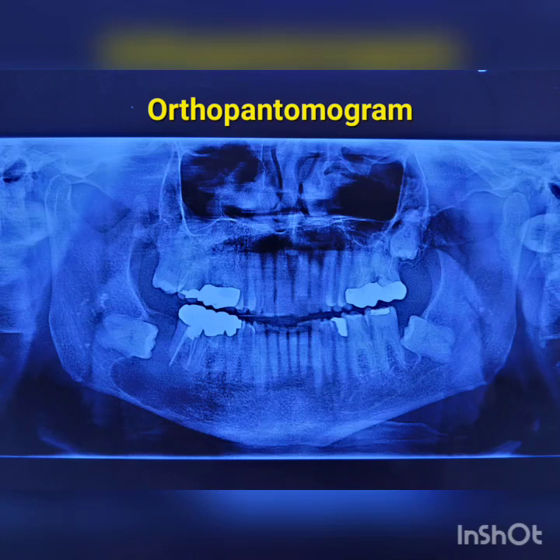unilocular around 3.5 centimeter diameter radiolucency around impacted 4-8 crown, and which is extending up to the first molar and base of the mandible, and it has well defined radioopaque margin posteriorly and ill defined margin anteriorly. It can be a dentigerous cyst or it can be a radicular cyst due to caries.